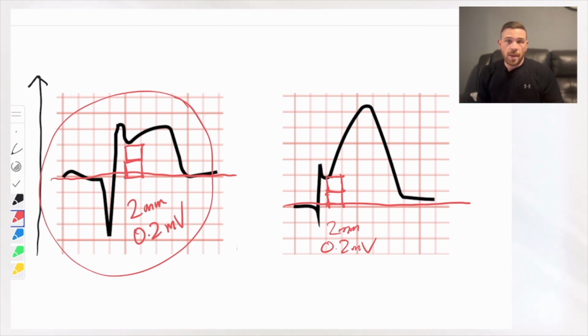So for an adult male, we usually look for 2 or more millimeters of ST elevation in contiguous leads to determine whether or not the patient is possibly having an MI. As you can see, that is just one example of how we use the measuring of the amplitude to help us in our diagnosis of the patient and guide our treatment.